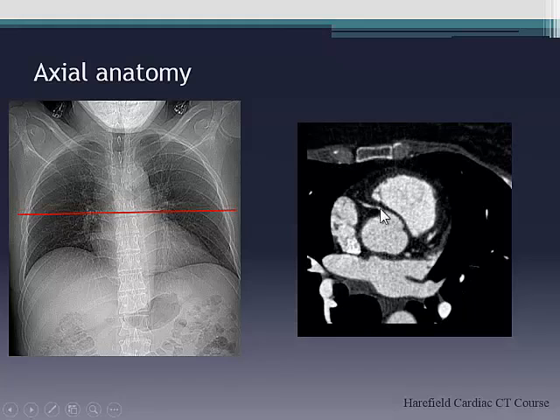Okay, moving down now, what you can see here is the origin of the right. You often see these diverticula, so these aren't necessarily pathological. In fact, they're normal variants. But it's good to familiarize yourself with the normal variants, because sometimes you'll be asked by one of your colleagues, oh, I've seen this on echo, what do you think? And if you're not used to looking at these structures, you'll find it difficult to say whether it's normal or abnormal. So try to develop a bank of what normal should look like, because it's extremely helpful.